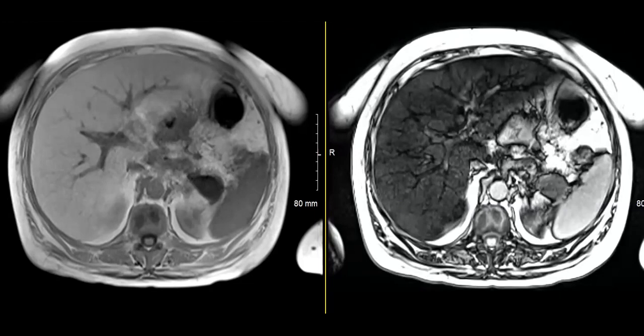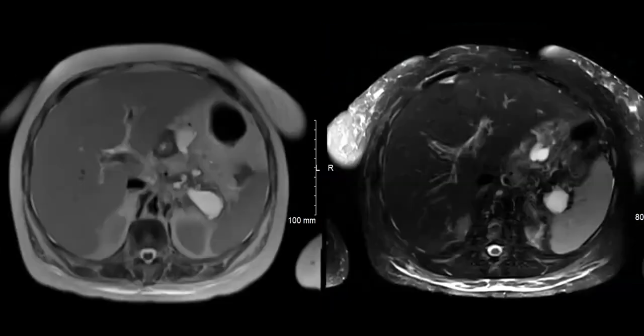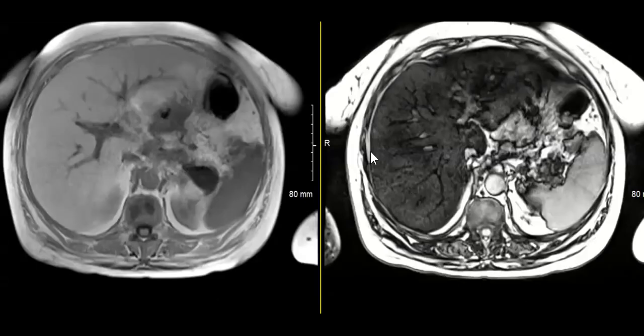It also looks like between the T2 and the T2 with fat sat that you showed, it was fatting out. So yeah, it's pretty fatty. Correct. I haven't seen this with the portal triads, but is it also at the edge of the liver you're seeing it on that out of phase? Like there was dropout? Because I haven't paid attention to that. So in this case, the India ink artifact between the liver and the fat is still seen.